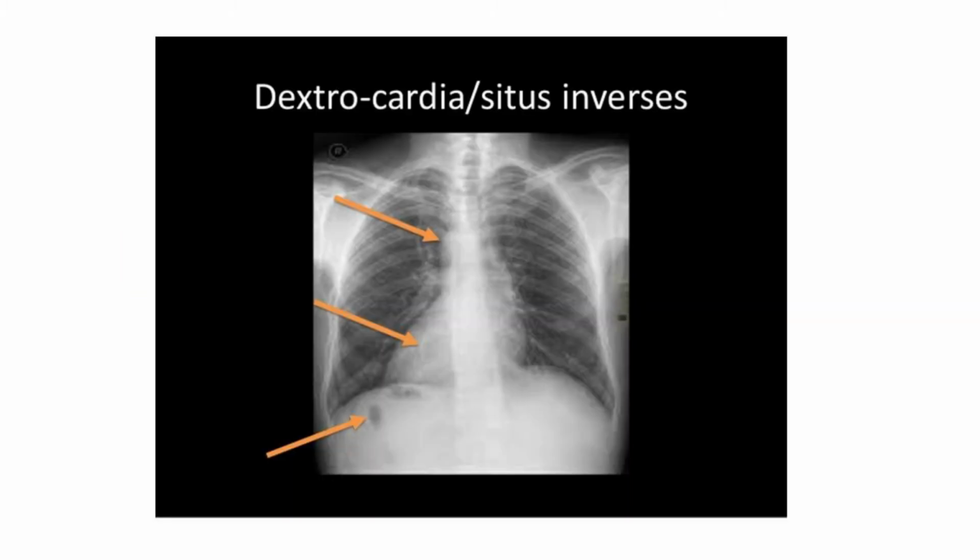This is the dextrocardia image, where the heart lies in the right side of the chest. It is mostly seen in few people. This is a normal condition. This doesn't cause any effect to the human beings.